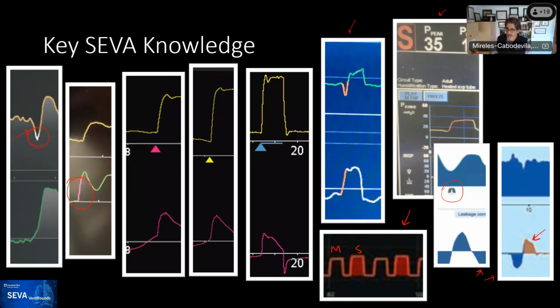Rob? And that just goes to show that some of these schemes are easier to read than others. I wonder on the Hamilton scheme if that's a challenge for colorblind people. And also to point out that the terms assisted and triggered are conflated by manufacturers frequently.